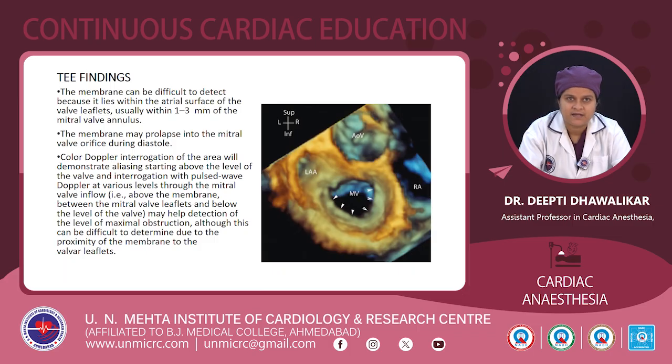TEE findings. The membrane can be difficult to detect because it lies on the atrial surface of the valve leaflets, usually within 1 to 3 millimeters of the mitral valve annulus. The membrane may prolapse into the mitral valve orifice during diastole. Color Doppler interrogation of the area will demonstrate aliasing starting above the level of the valve, and interrogation with pulsed wave Doppler at various levels of the mitral valve inflow, that is, above the membrane, between the mitral valve leaflets, and below the level of the valve, may help detection of the level of maximum obstruction, although this can be difficult to determine due to proximity of the membrane to the valvular leaflets.